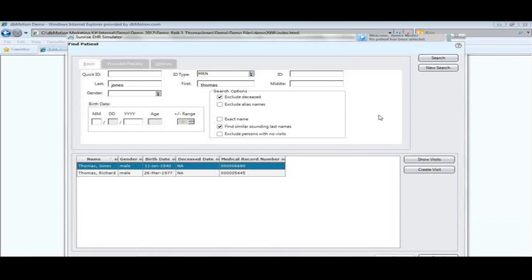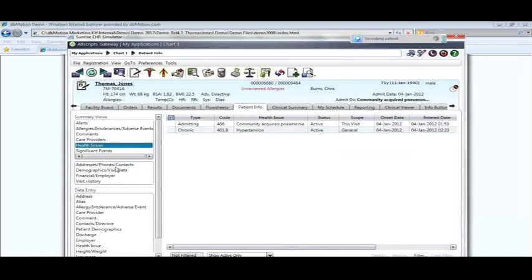As I was saying, you should see now we're signed into Sunrise. You can see this little floating window here. This is the EHR agent. Keep an eye on this. I'm going to go ahead and click on this patient, Thomas Jones, and you'll see the agent now recognize that Thomas Jones in context. Let me tell you what's going on here, what the workflow is.